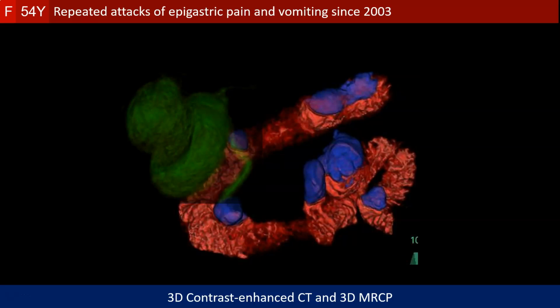It is because we have 2 inviting factors for inflammation: the para-ampullary diverticulum and the rest of the duodenal and jejunal diverticula, and the cystic duct choledochal cyst. Both of these structures will invite infection because of the stagnation of their content.